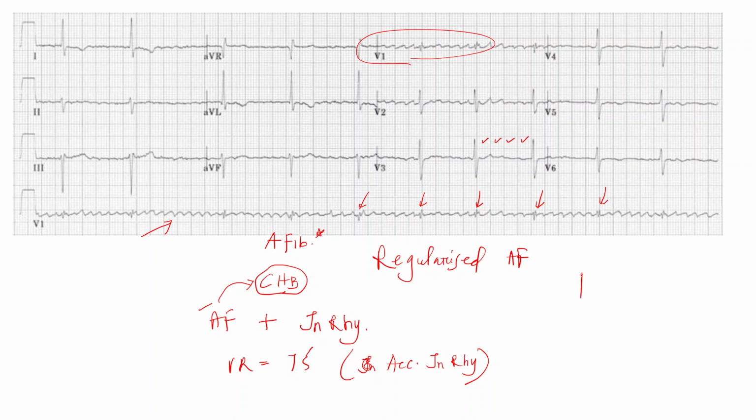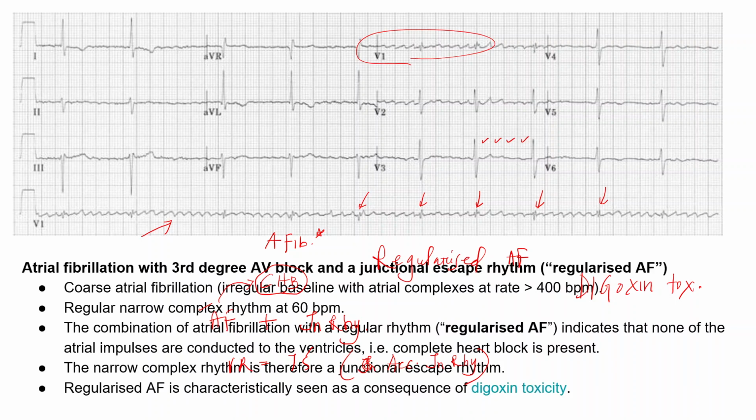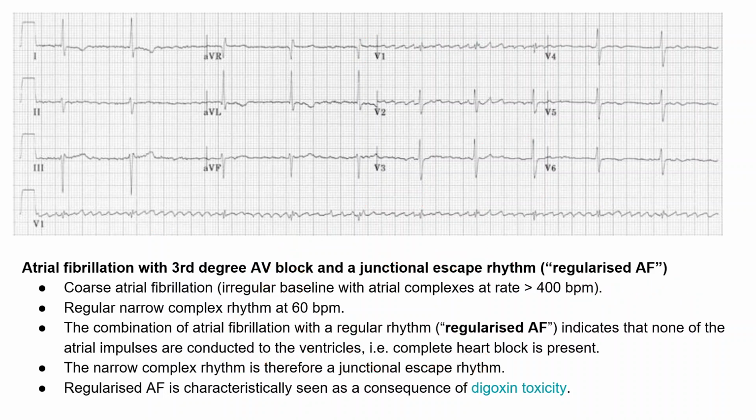This is a classical ECG which is seen in digoxin toxicity. Okay. So all these things are written here. Whatever I'm saying, it's a regularized AF, and this is classically seen in digoxin toxicity.